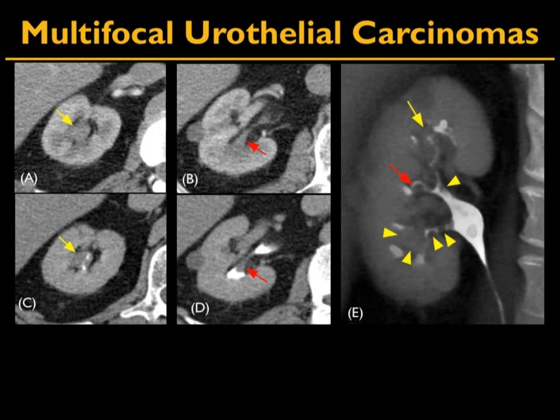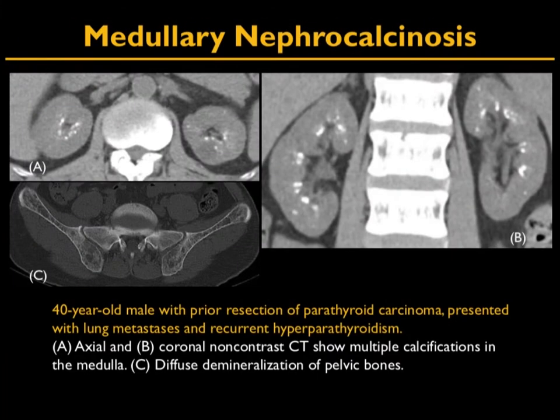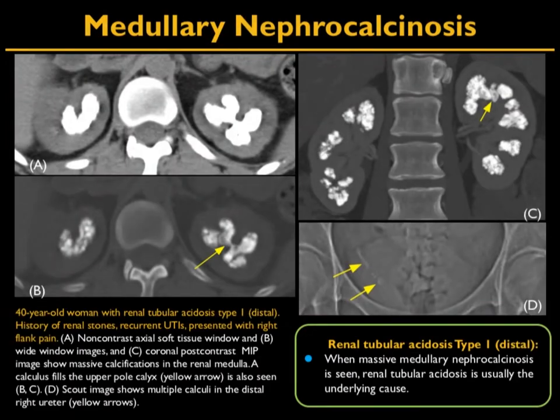So very, very important. I mentioned to you medullary nephrocalcinosis before, and I'm just going to show you another example because I wanted to show you just the difference, why you're not going to have a problem confusing this case with transitional cell carcinoma. Obviously, things look significantly different.